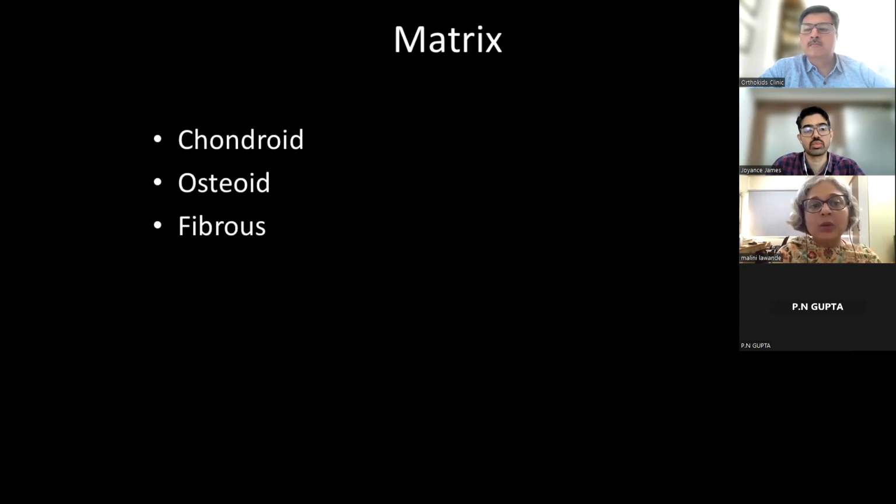So how do we start looking at the MR? Okay, now we have done an MR with good quality following all of these things. We have the right sequences. So I think the first thing we start looking at is: is the lesion well-defined or ill-defined? But it's not like X-ray. A well-defined lesion does not exclude malignancy. An ill-defined lesion on MR does not mean it is malignancy.